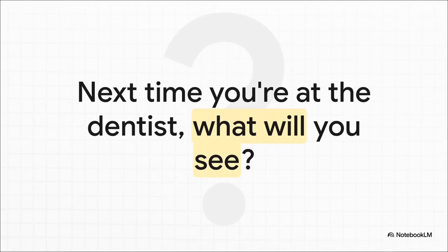So, the next time you're sitting in that chair and your dentist puts that image up on the screen, you're not going to just see a confusing jumble of black and white. You're going to see a story. And now you have a much better idea of how to read it. What new details will you be able to spot?